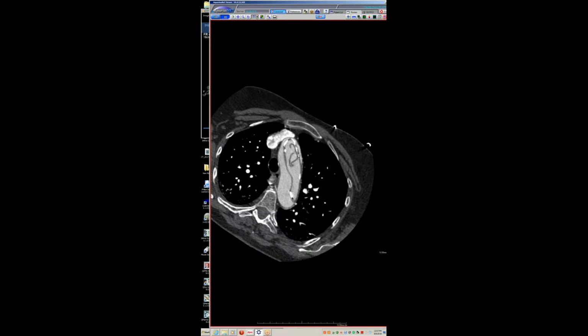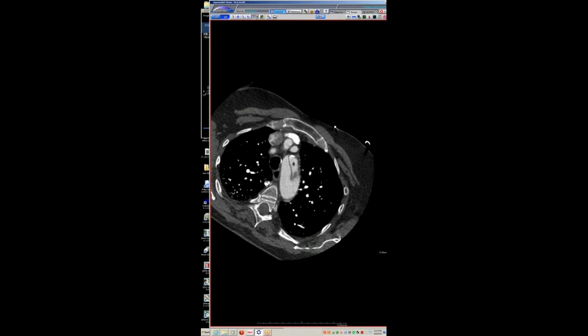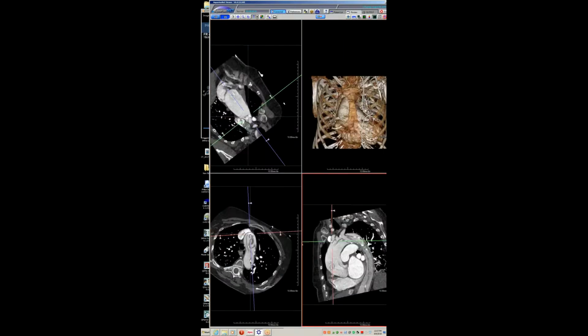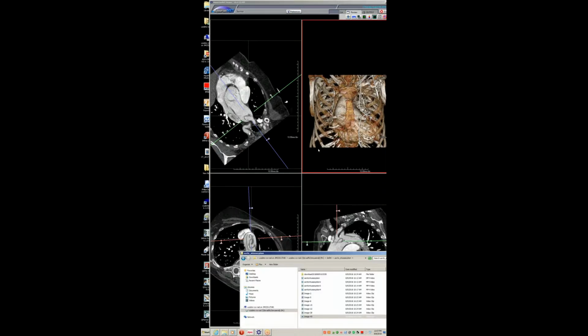Right, because this whole convoluted infolding of flap is very odd. So I'm assuming some of this, if you can see the arrows, following the arrows, is the other portion that came up and is flopping around in that direction. Exactly. And then depending on the timing of the contrast image acquisition, at least with respect to the flap in the proximal ascending aorta, you may see it either going backwards through the valve or forwards through the valve.